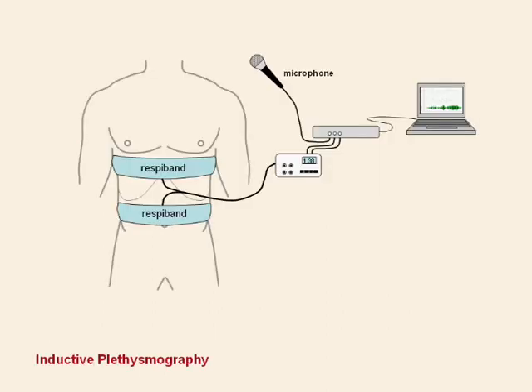In the previous video, we saw how inductive plethysmography could be employed to record the respiratory movements used by singers. This video will demonstrate how displaying the information in the form of Konno-Mead diagrams can make it easier to interpret. First, however, we will examine an important feature of the respiratory traces that we will encounter later on in the Konno-Mead diagrams.